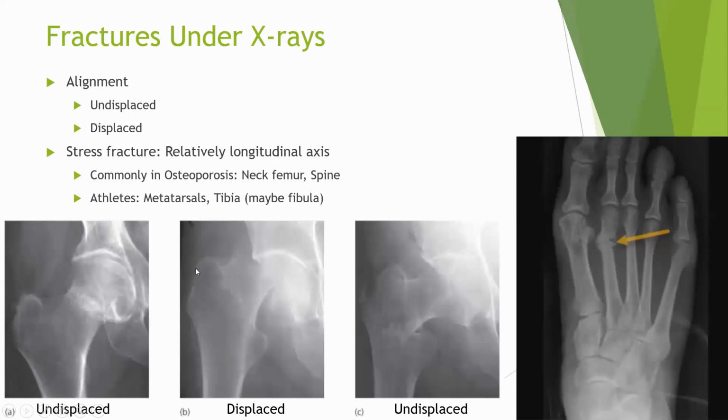Here, look at the beautiful greater trochanter. If the femur is rotated posteriorly, the greater trochanter comes anteriorly, and that is exactly what you are seeing in your X-ray view.